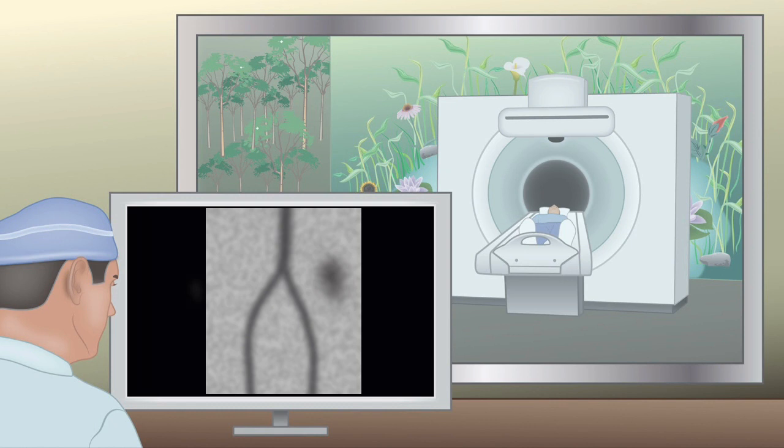And over a period of time, in this case, there was diverticular bleeding. There was an opacification of the sigmoid area, and with time, it has increased in size, which gives a rough idea that it is probably coming from the sigmoid colon, and the radiologist could go to that site and consider embolization therapy, or the surgeon may consider doing a sigmoid colectomy, depending upon what the team decides.